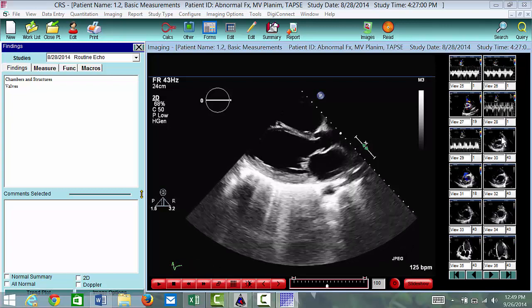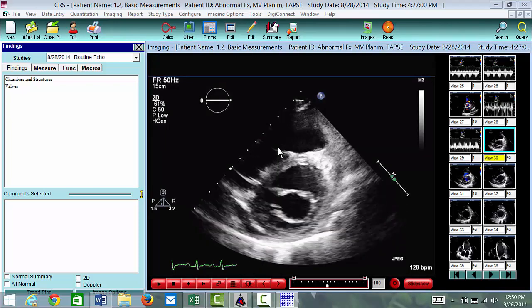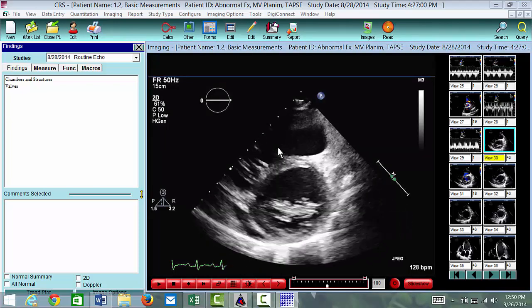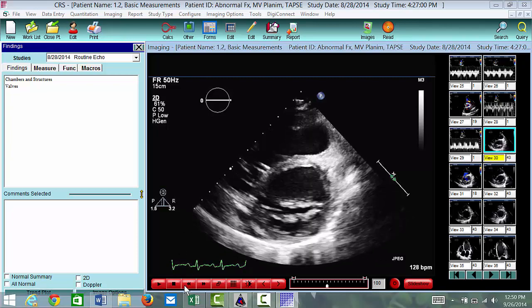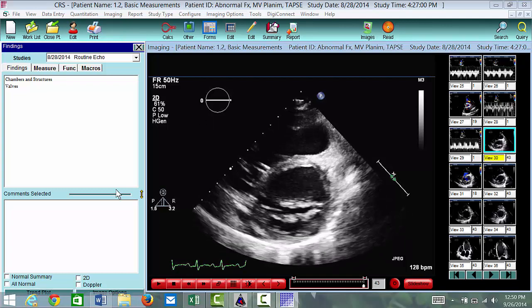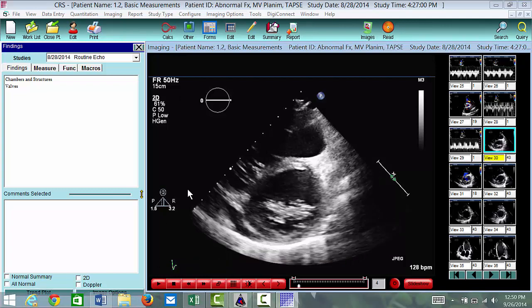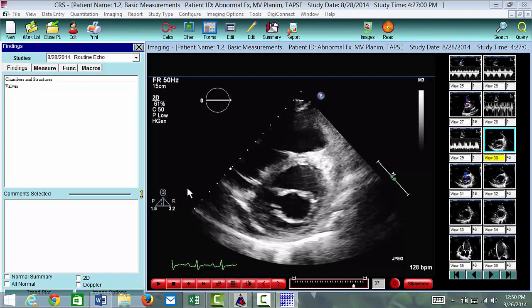and if you wanted to planimeter the mitral valve, this is a fairly normal planimeter, or the size is normal. I have also added an abnormal mitral stenosis at the very end of this case study on the laptop that you'll see at the Learning Lab. To measure this, again, you can pause either before or after the U-click calcs, doesn't really matter. And then we'll go to where we want to measure, or where we want to planimeter.